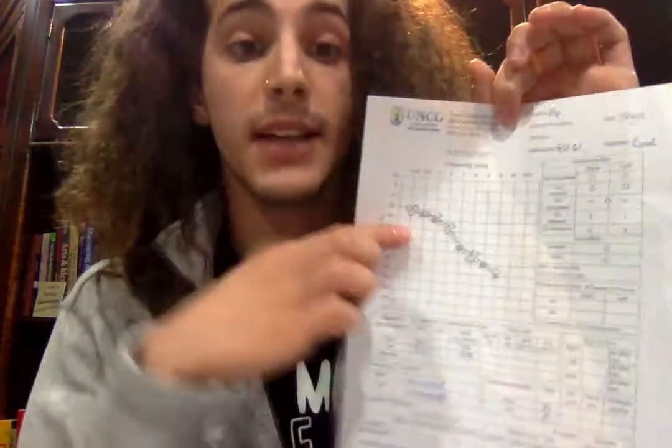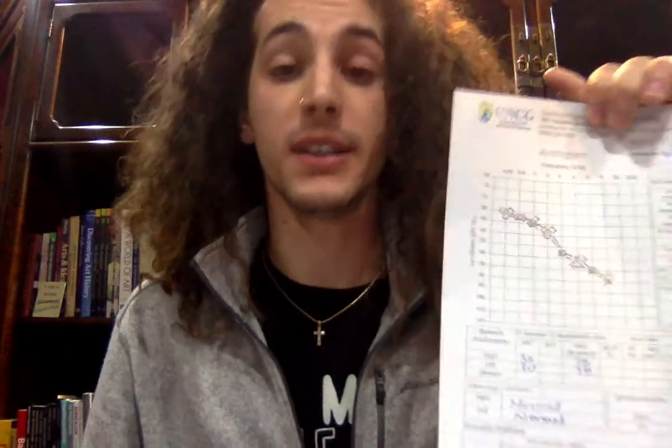The degree is very severe, and that is because the values are dropping down quite low. Most of them in the later end are between 70 and 90, which determines a severe loss, which is something that we would like to be able to take care of sooner rather than later.